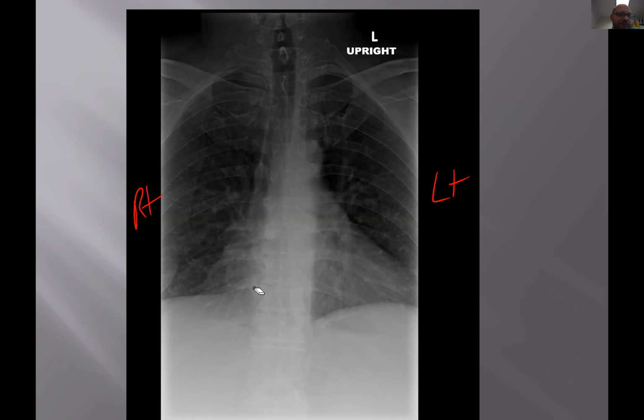Other stuff. Keep going. Would you say the part enlarged on the lower left is cardiomegaly, or do you think that's more of a collapsed lung over there? Okay, good finding. Because this is an AP thoracic, then all bets are off with diagnosing cardiomegaly.